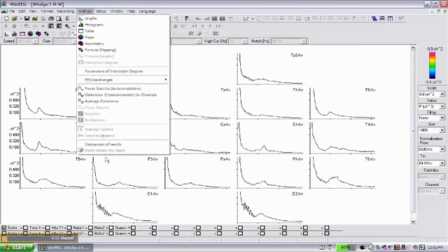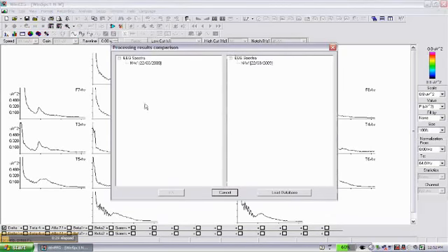So you go to analysis, click the option comparison of results. In a way we have a possibility to compare the spectra with the normative data, or with spectra computed, say, 2 days ago. So we can easily do a pre and post comparison. We can compare spectra with some other spectra, or with grand average, or whatever. There are many possibilities for comparison of results.